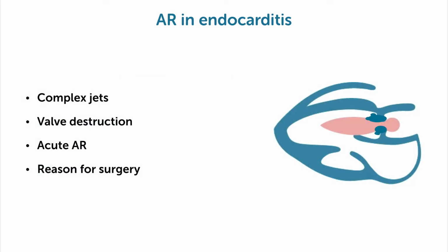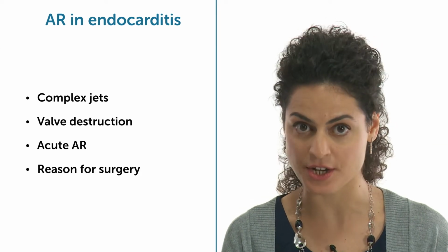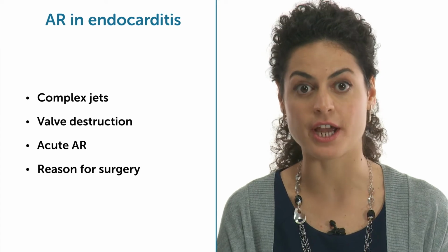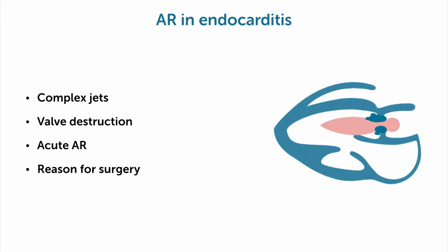So AR can be caused by endocarditis. Usually the jets are complex because we have valvular destruction. This is also responsible for acute AR, and it's a good reason to send the patient to surgery, especially if he's hemodynamically unstable.